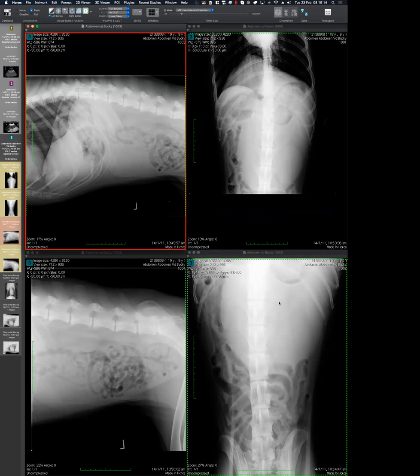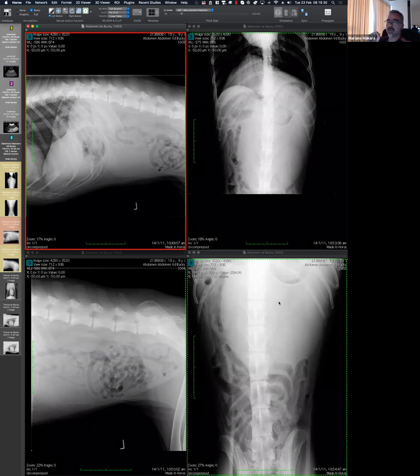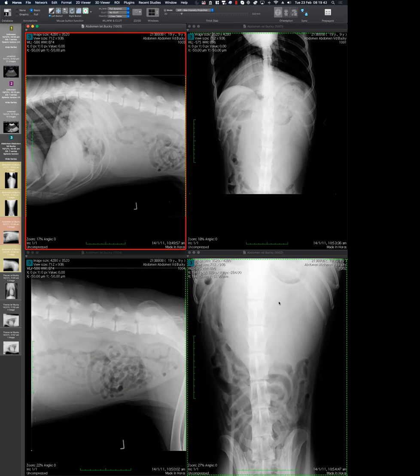An intestinal mass? Yeah, I think it's probably less likely, but I don't think we can remove it from the list. I would probably remove the idea of left adrenal mass, because if it's going to get that big, it somehow needs to bother the kidney. Makes sense, because they are too close, and I would expect some degree of displacement.